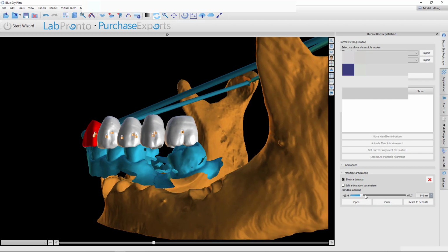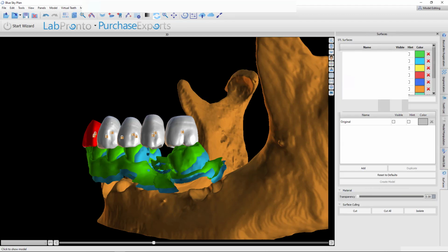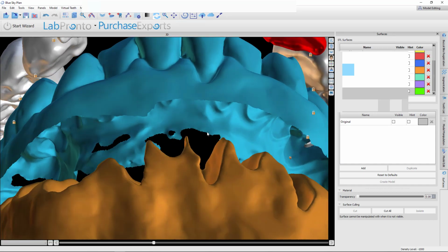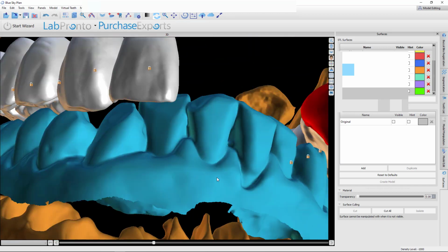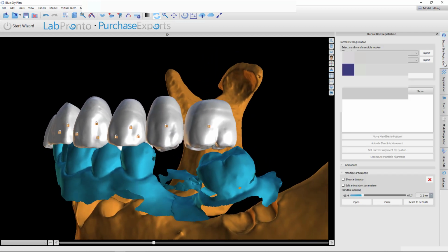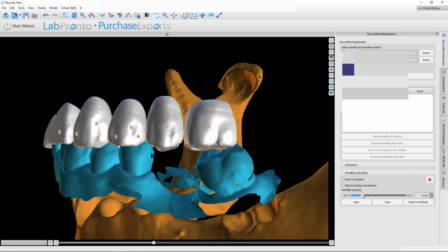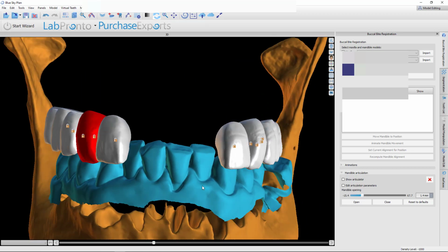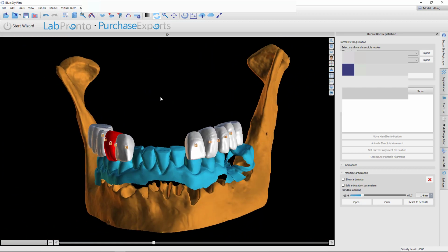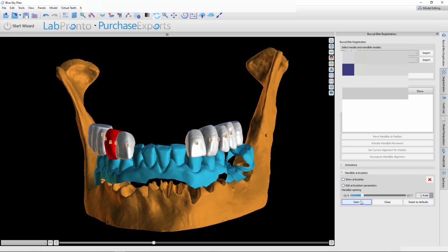All right, so I'm looking from the lateral view, and I'm going to open this just a bit. Not much at all. All right, I'm going to hide his other jaw because I do keep one of those untouched, and I'm just eyeballing this. And really, I think I don't even have to open it as much as I did. All right, so the posteriors look very closely aligned now. So this is what I'm going to use as the new bite.